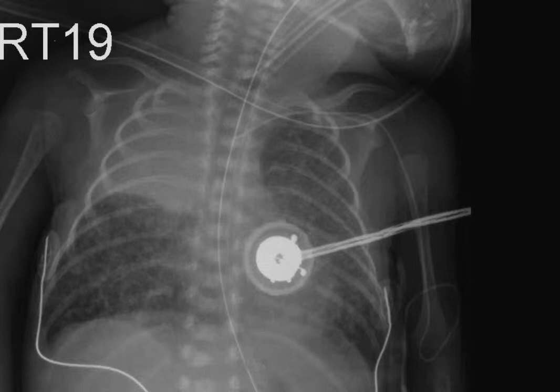This is a patient with complete collapse of the right upper lobe, and I'm only showing this because for some reason in newborns that I've never seen an explanation for, when you get complete collapse of the right upper lobe, the minor fissure maintains its normal position for some reason which I can't explain. Because you know this right upper lobe is completely collapsed because it's completely water density, the same density as the liver. So don't let that make you think you're dealing with a pneumonia, classic for complete collapse of the right upper lobe in the newborn period.